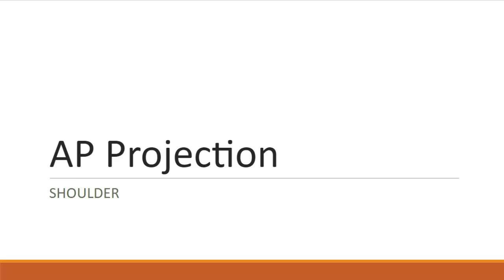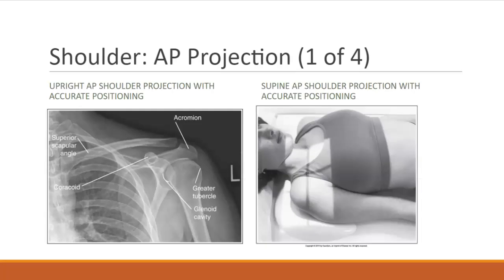Welcome to the image analysis of the shoulder. We're going to start with the AP projection.